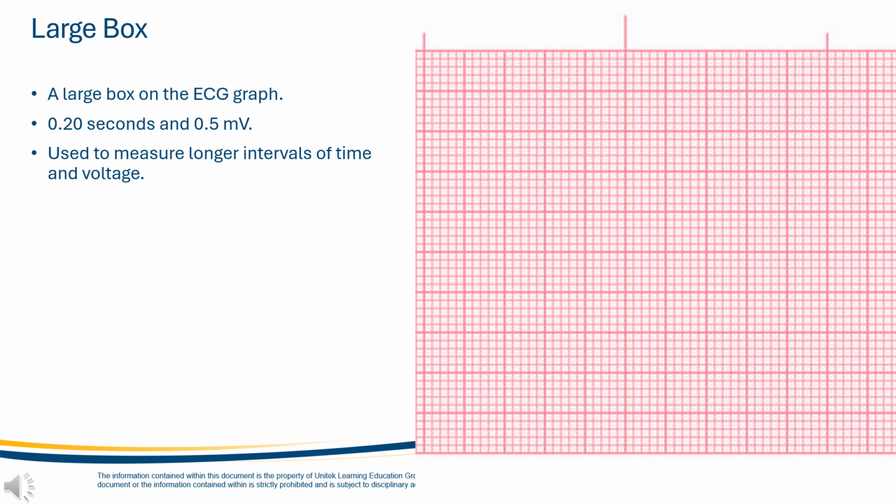The QRS complex, well, that amplitude can vary very widely, but it's usually between 1 and 3 large boxes, so 0.5 to 1.5 millivolts. An excessively high amplitude may indicate hypertrophy of the ventricles. A very low amplitude, well, we might have pericardial effusion. Our patient might be obese. Our patient might be hypothyroid. There's a few different things. So remember that we're going to diagnose arrhythmias and evaluate heart function using these large boxes.